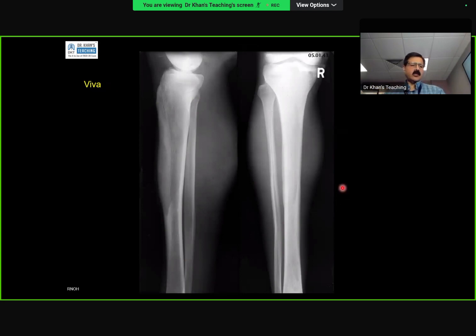Over to you, candidate 6. Your case, please. Yes, I have been presented with frontal and lateral radiograph for the leg.